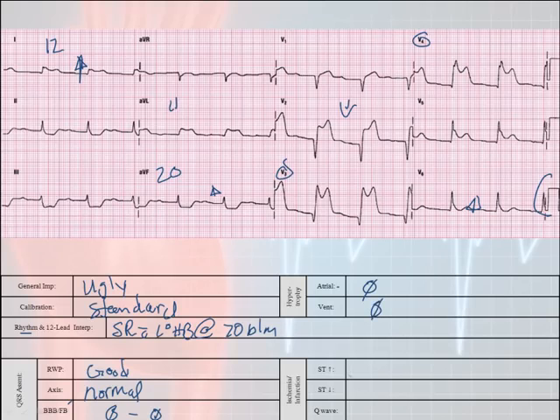Now let's look at my ST segment elevation. Oh, goody. I would have to have a piece of paper to really draw this out, but that might be some elevation in V1, V2, and definitely V3, V4, V5, and V6.